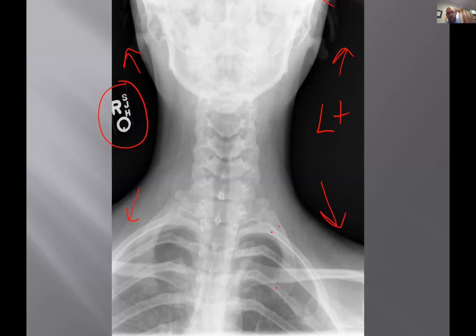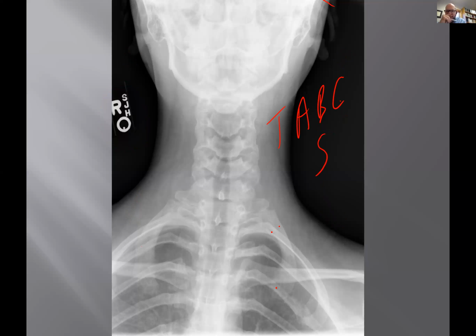Guys, look for those big, thick ribs like that. Some people carry bags on one shoulder. You do that at college for too long, and you'll thicken out that first rib like that, and it could develop a stress fracture. But there is a definite fracture in that rib. So not a huge finding to worry about, but it's fun for the importance of detection. And the key is you're only going to see that if you do technical, alignment, bone, cartilage, and the soft tissues in your flow, and you look at all 4 corners.